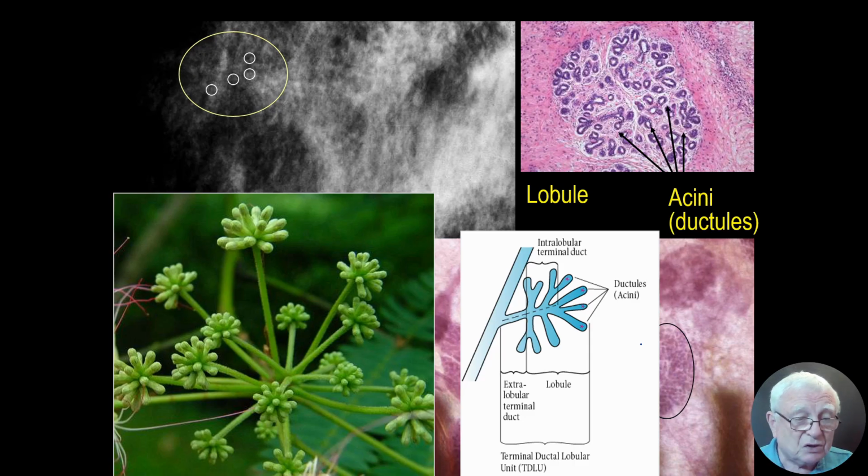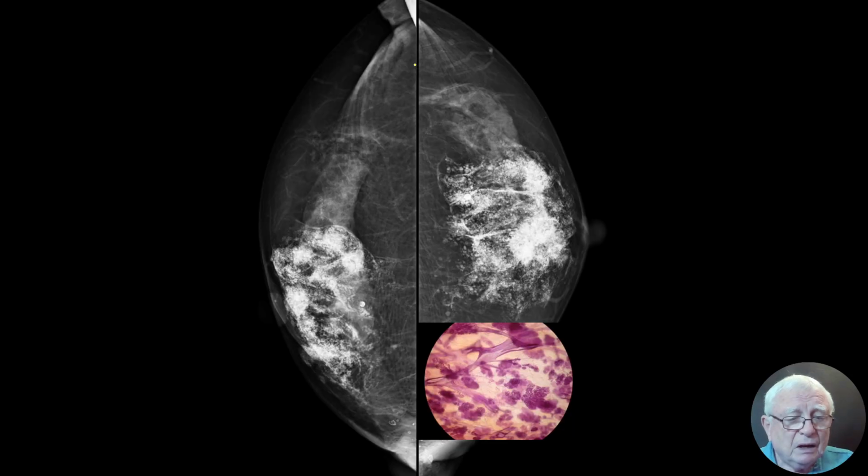And of course, radiologists, we have to accept the fact that the resolution, being able to show details, is much lower on the mammogram and extremely low on MR. But it's extremely good in pathology. So we have to find a middleman between the superb resolution and the low resolution, and that's the 3D pathology. How do you visualize the TDLUs? I showed you mammogram.